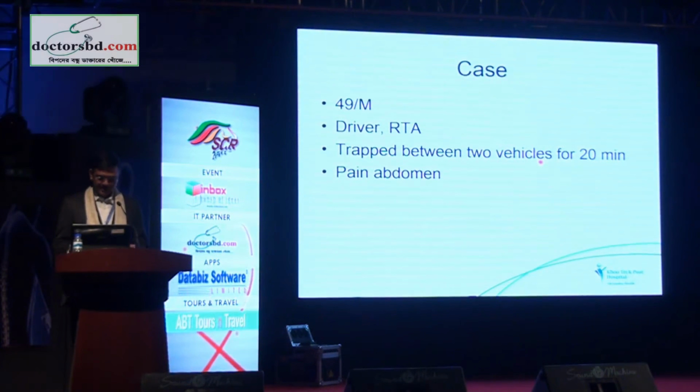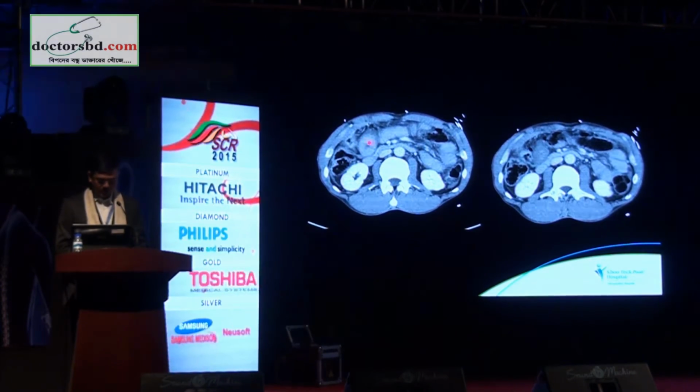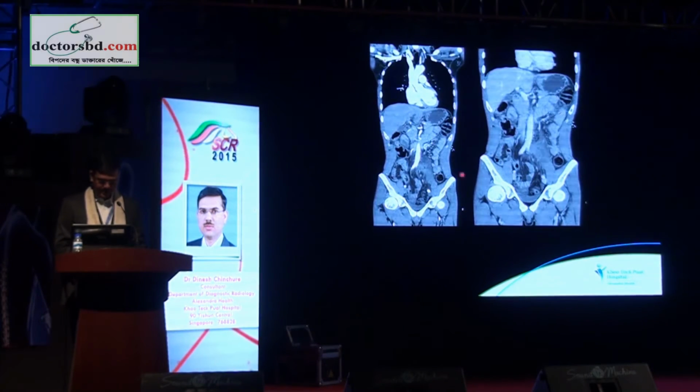Another middle-aged man, driver, and had RTA. We can see that this is a loop of bowel which is thickened, and you see this enhancing as we come down. This is the next section, the lower section than this in actual images. We see this doesn't enhance.